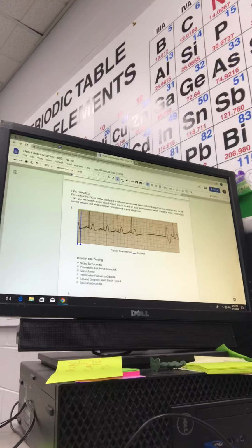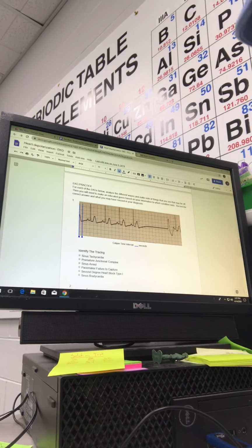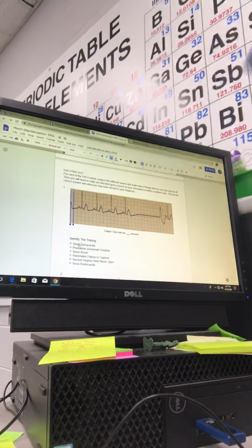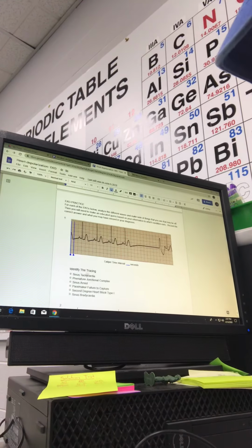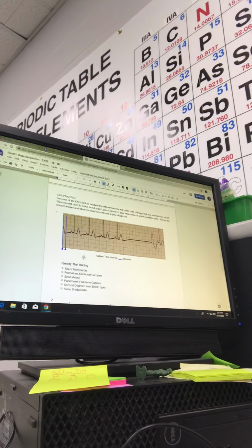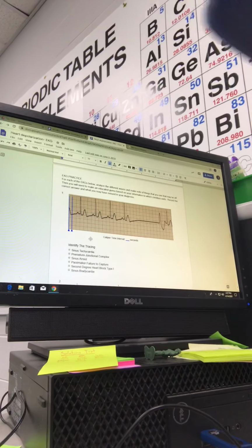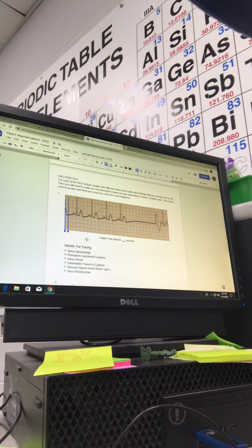Here we go again. So now the EKG practice. What we have here is an EKG with something going on. You have these different conditions. You're probably like, what the heck is sinus tachycardia? I don't know. Anyway, you have all these different conditions, and if you find this really interesting, you can go in and do some research. Well, what does this really mean? How does this affect a patient or an individual who has tachycardia?